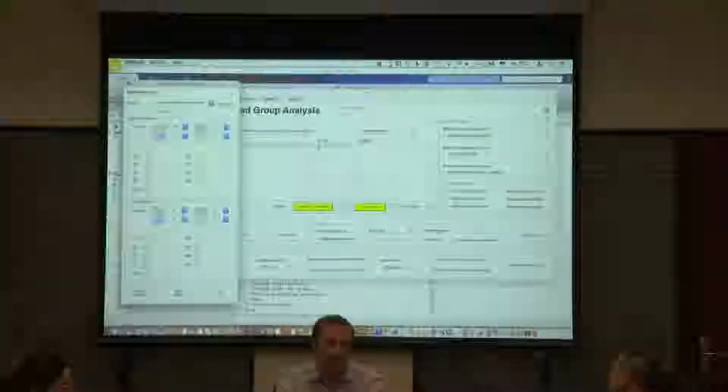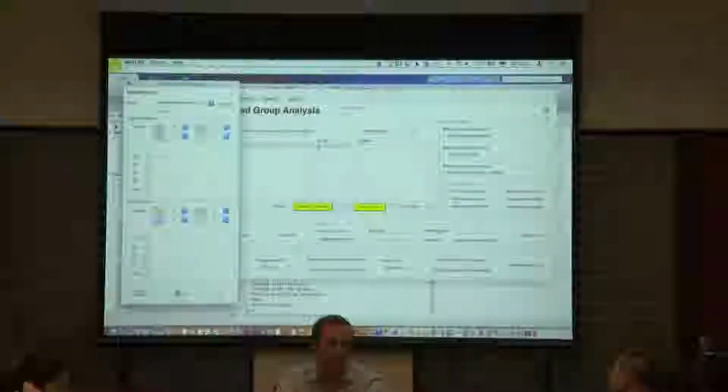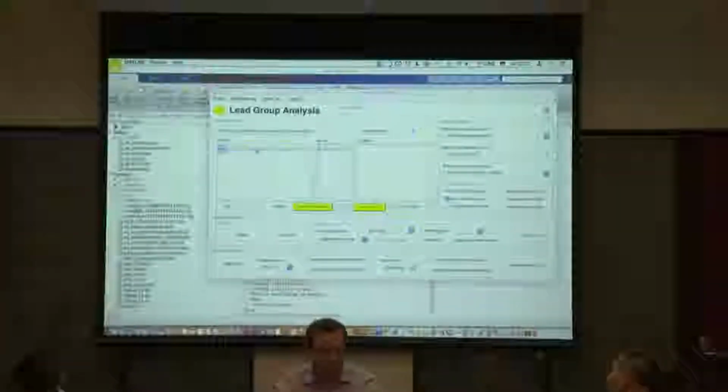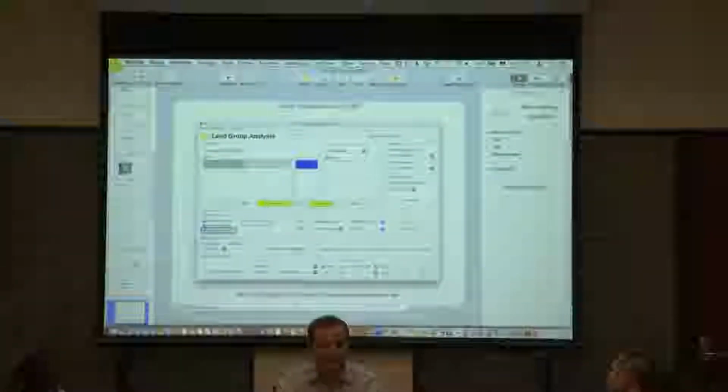So we say maybe let's put 2 milliamps on this contact, and then we say just next patient, and we see up here now subject 2 has a different electrode, so it's a 4 electrode lead, so we maybe say 2 volts for this patient, and then subject 3 we take 3 volts, and we save that, and now we have the stimulation parameters saved inside here. Good. So that's that. That's also fine. Next patient and save. And group colors. Okay. Alright.